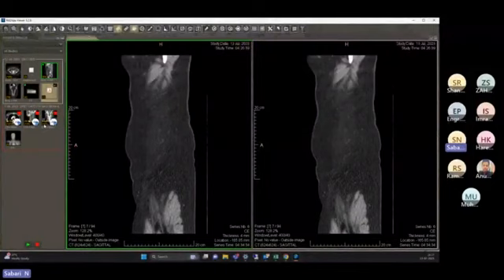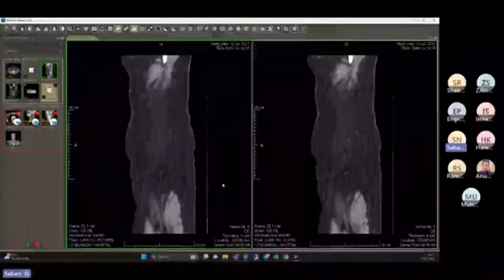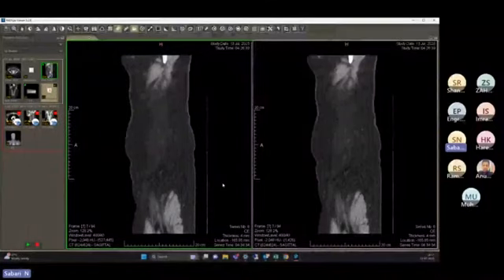In 1 week or 10 days, you will see your disk becoming full. So there is no space on your disk, and you cannot access anything. It will not allow you to do anything if there is no space on the disk. Your system becomes slow. The radiology reporting time will also be delayed.